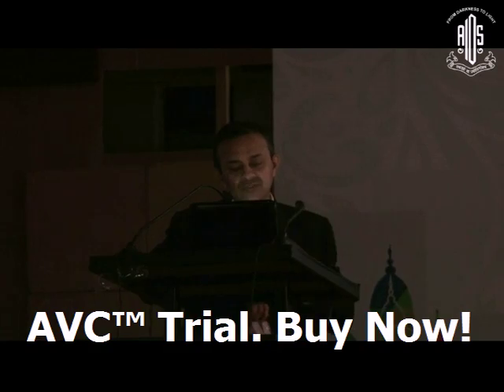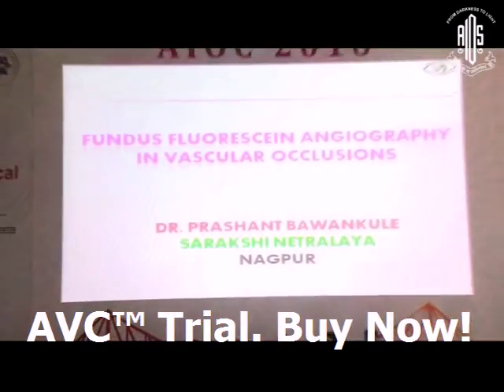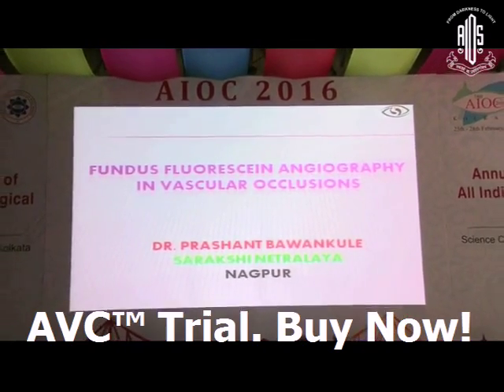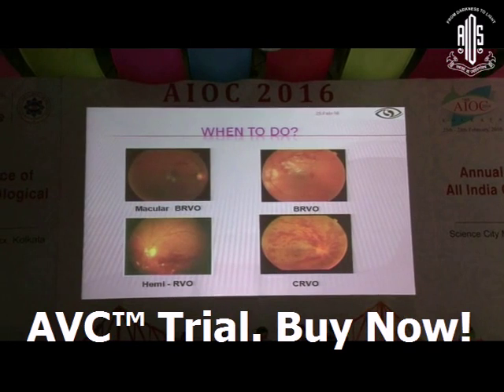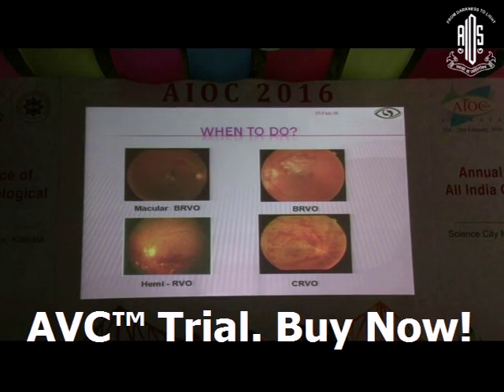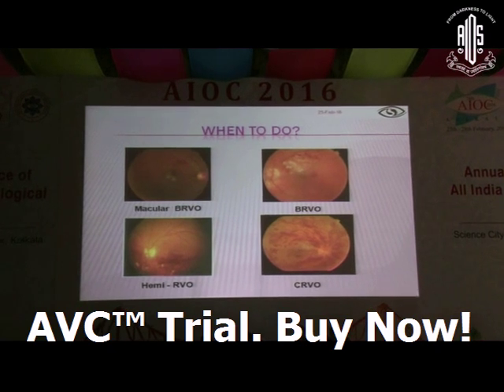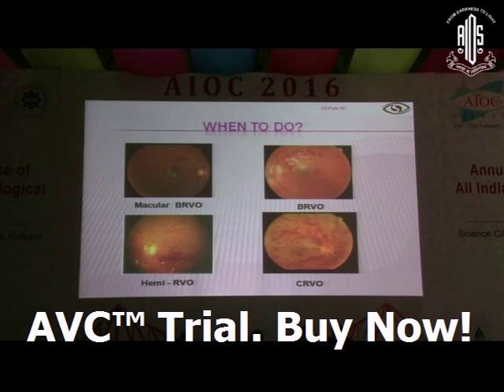Now, having understood the basics of fluorescein angiography, let's move to the clinical condition. We start with venous occlusions. The venous occlusion can have various clinical presentations, from minimal macular branch retinal vein occlusion to central retinal vein occlusion. And in all the cases, to understand what is happening at a physiological level, you need to do an angiogram as a basic investigation.